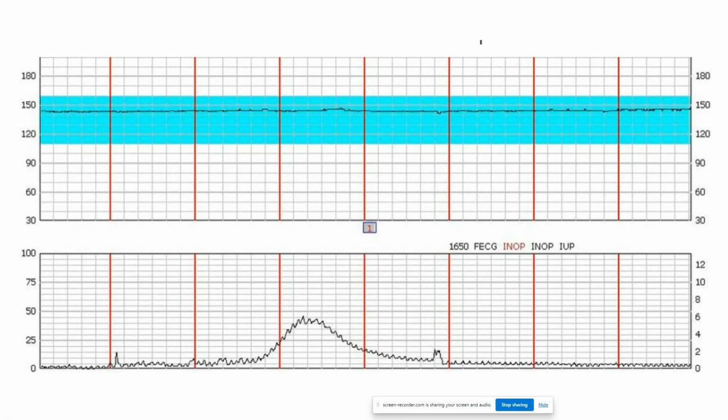And what about this? What is the variability for this one? This is what we would consider an absent variability. This is where our baby is in trouble. We need to go ahead and call the doctor immediately, and he will likely do an emergency C-section to get this baby out. This tells us that our baby is not well oxygenated. And this is a very scary thing to look at, really, when you are working on the labor and delivery floor. So this is what we would consider an absent variability.